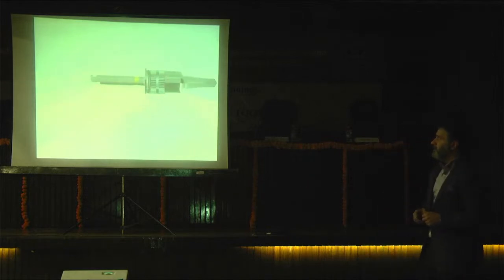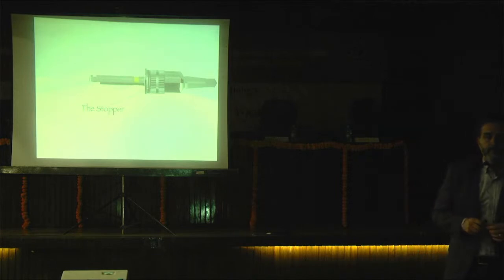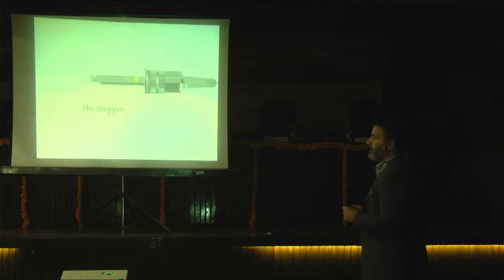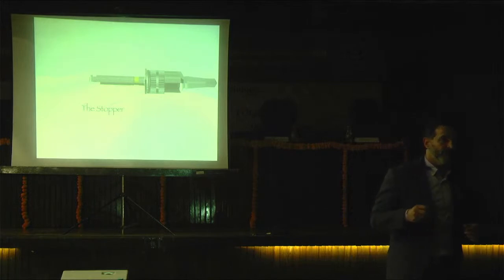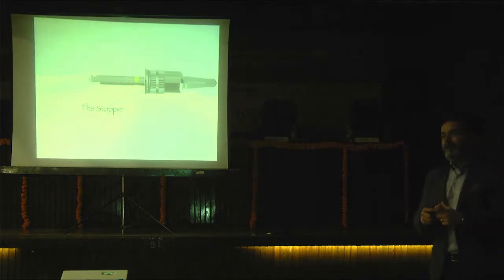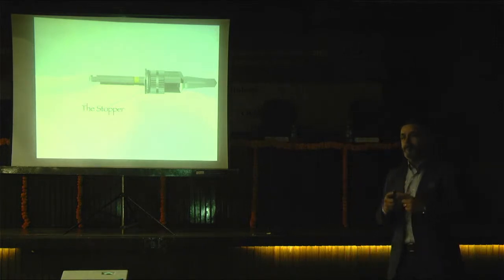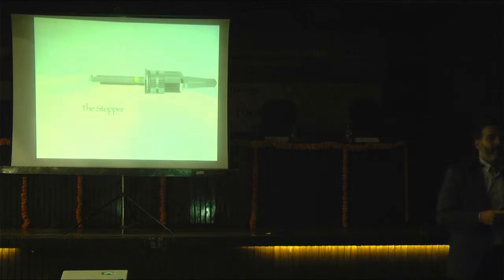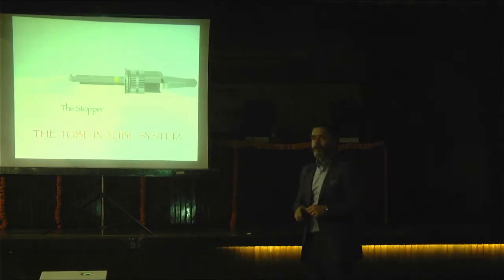And when you start, there is a stopper. By this way, you may have the depth control. So it is under control. And for example, think that you want to do the wrong thing, but the guide doesn't let you do the wrong thing because it was planned in the MSoft program, and the sleeves were placed in the best way, in the right way. And if you want to do the wrong thing, the guide doesn't help you. So this is what we call the tube-in-tube system.